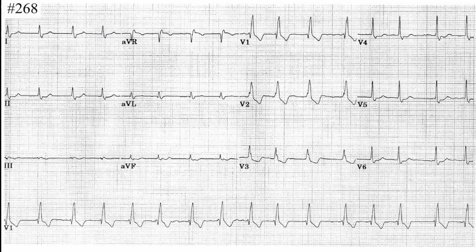Okay. Axis. Lead I is positive and aVF is also positive. Both positive, so this is why we said the axis is normal. So there is no hemiblock? No, nothing at all.